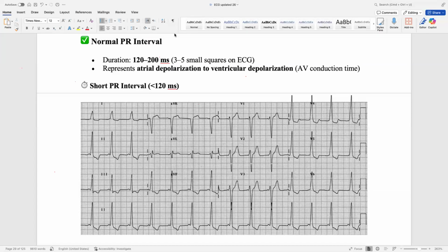Of course, if you have ST segment depression, it may be a mirror image of elevation. So if you have ST segment depression, this is the S, this is the T, and it is below the isoelectric line. So this is ST segment depression.